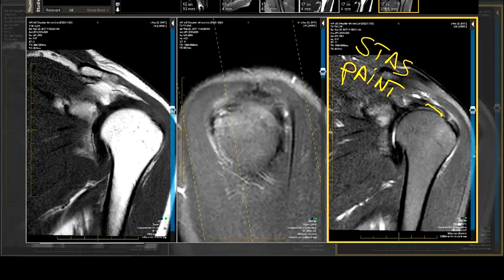And you should have all of those facets in your discussion of the rotator cuff and describe the muscularity and the presence of fatty infiltration and the presence or absence of subacromial or subcoracoid arch stenosis and the overall status of the joint, its conformity, and look at the centering. People that have rotator cuff insufficiency, the humeral head goes up. This one does, right? It's decentered. There's the scapulohumeral line, should be down here. Loss of the normal depressor mechanism from rotator cuff insufficiency, and usually weakness of the shrug mechanism.